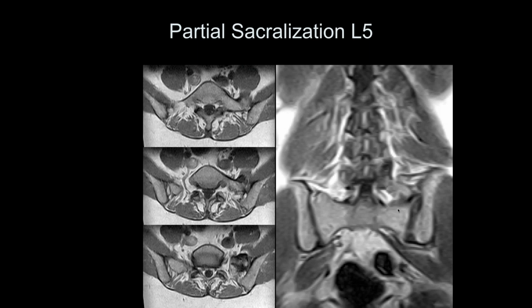Oblique X-rays should pick it up probably easier than MRI. Okay. What do you think? It can, yeah. I think they can pick it up. Sometimes the sacrum kind of overlies that area. This is an area that can be picked up well with cross-sectional imaging, but oblique X-ray is one of the reasons we always got obliques in the past, and people who do X-rays still do, to be able to evaluate this lesion. But it is tough to see on X-rays alone because you've got the sacrum overlying this.